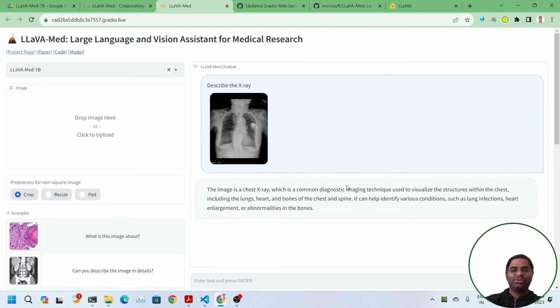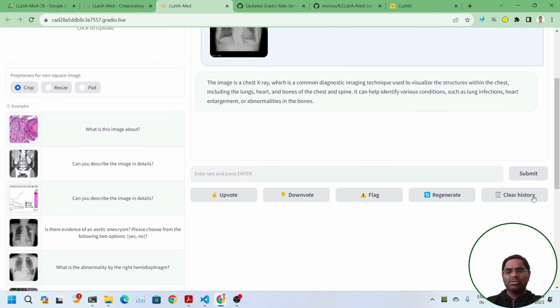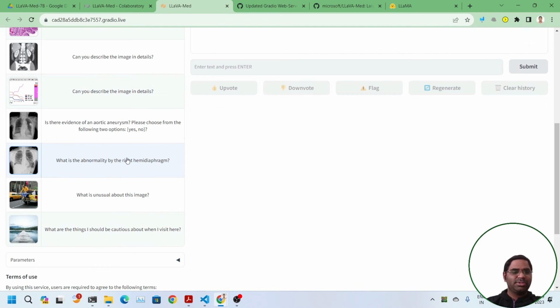I will again use the same image and I will change the prompt this time: describe the X-ray. So personally, I don't think it is a good description. Any radiologist watching this video can better comment on it. We'll move to the next example.